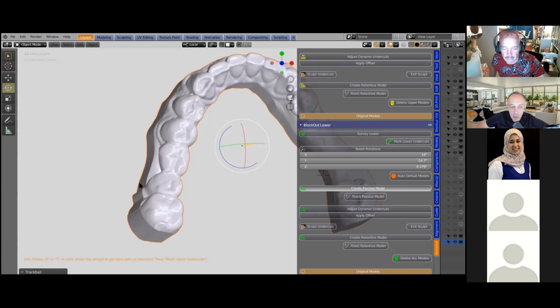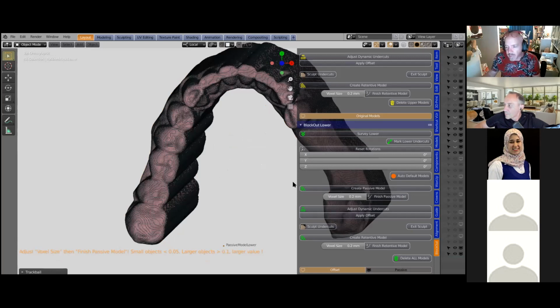So Blender has an auto-save feature where, if ever it does crash, often you can get back to the last scene that you were just working on. It's a good idea to set it to, well, I think by default it's set to 2 minutes. So you can set it to 1 minute or something as well. Or just save after each crucial step, which I should have done anyway.